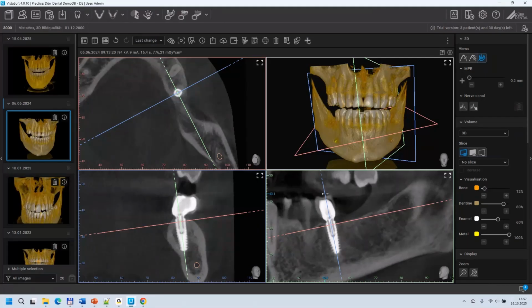And that's always important to understand. As long as you are doing a measurement in the 3D image, you have to think of what you wanted to measure and in which orientation and which alignment you wanted to measure. And that's why I wanted to let you see this kind of alignment of all those planes.